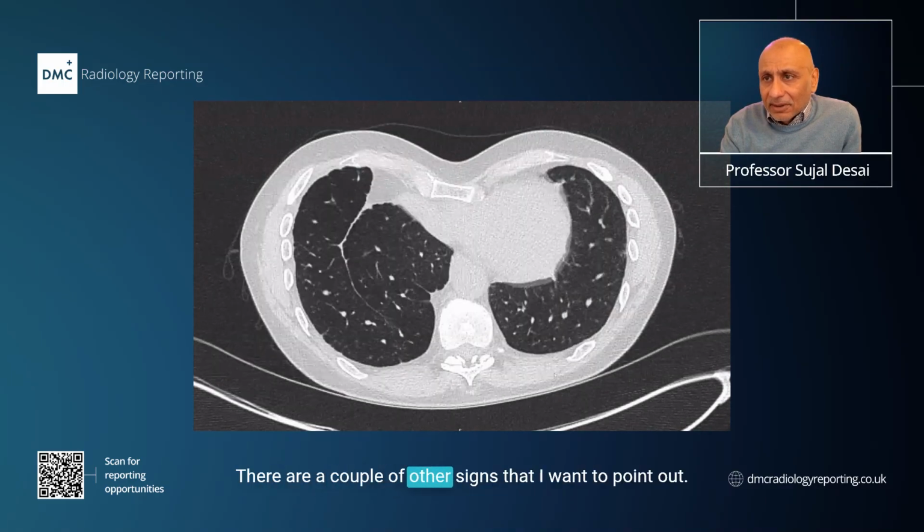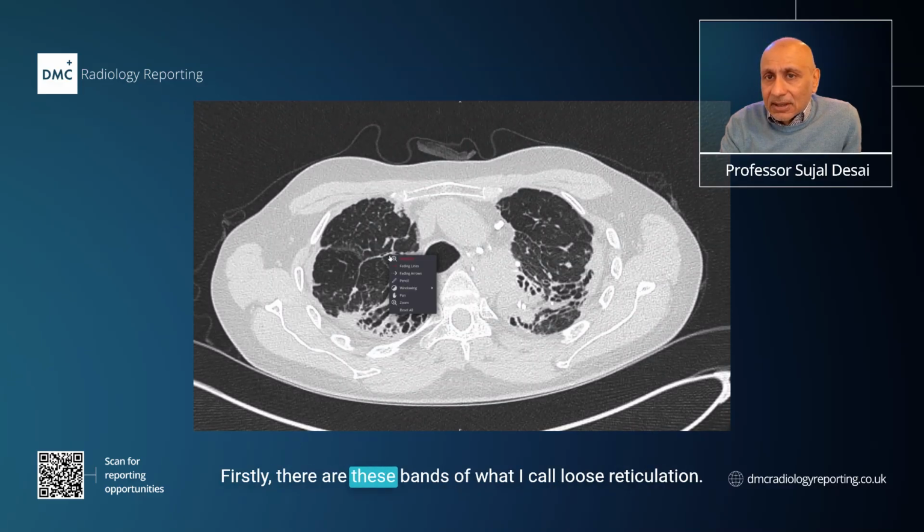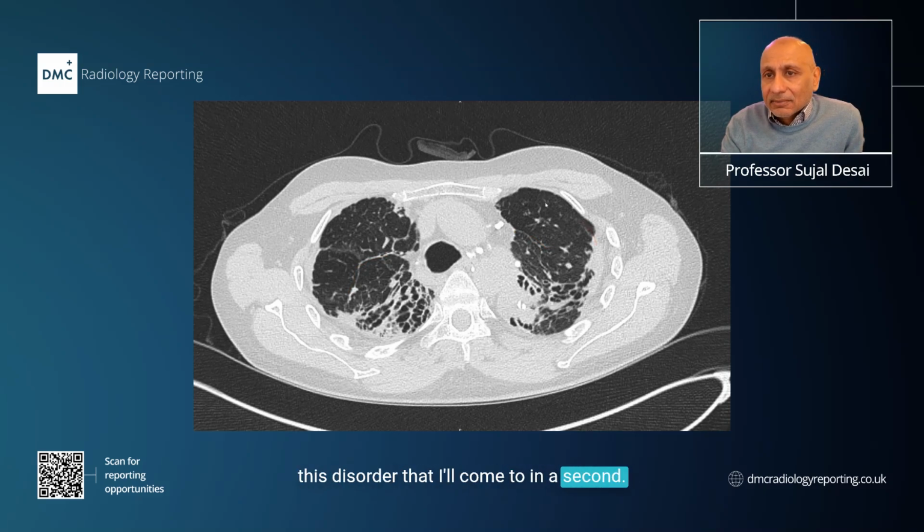There are a couple of other signs that I want to point out. Firstly, there are these bands of what I call loose reticulation. And I think this is something that we see in this disorder that I'll come to in a second.